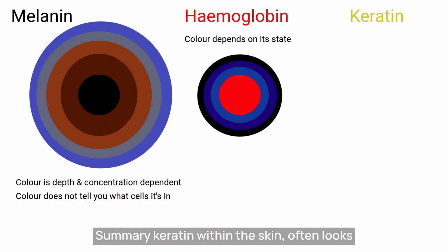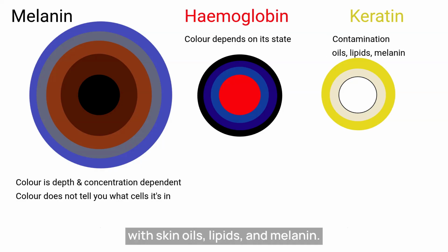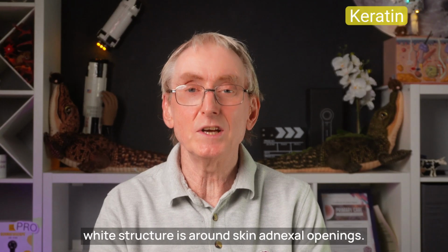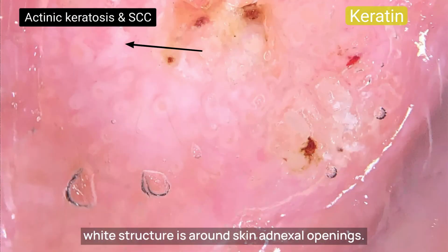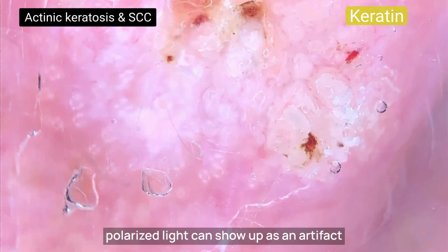Summary: keratin within the skin often looks white due to light reflection and may have a slight yellow tinge due to contamination with skin oils, lipids and melanin. Another example of disordered keratin causing a white structure is around skin adnexal openings. These often appear as white circles, or under polarized light can show up as an artifact producing rosettes, these four dots of light.